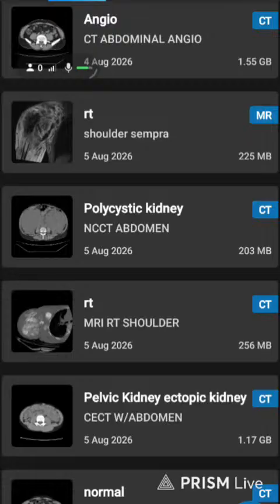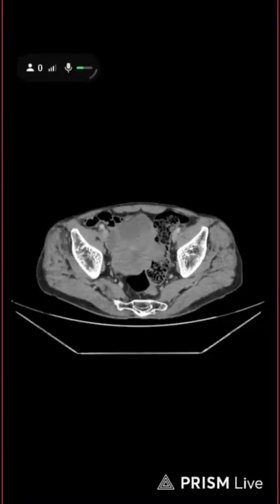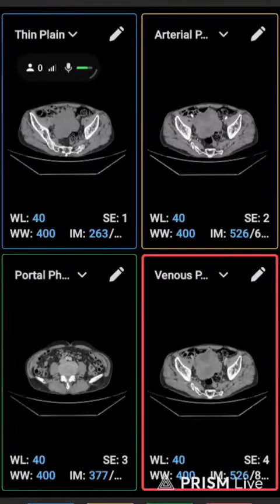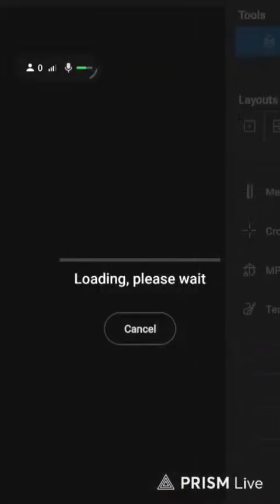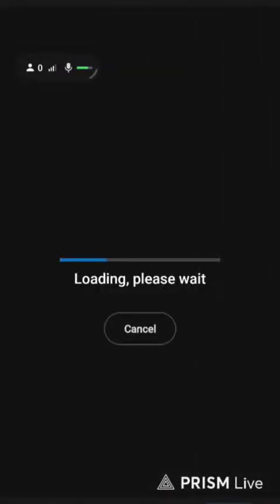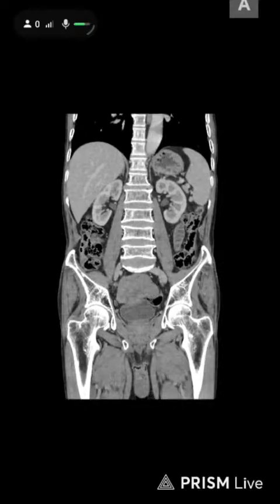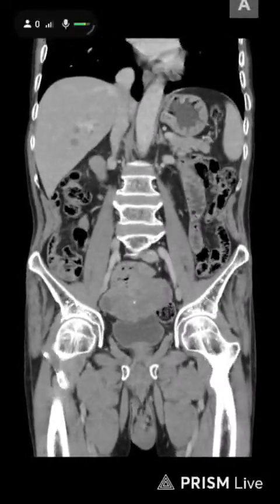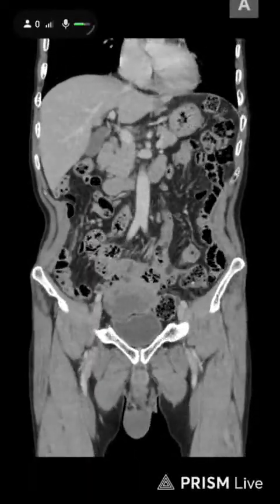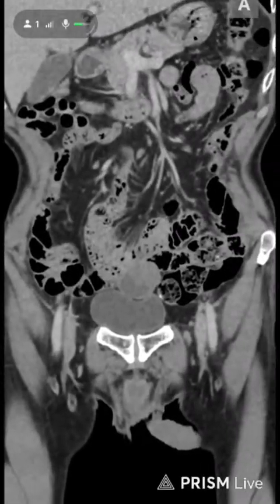Also we have an abdomen. Here you can see in this venous phase I found a different thing, but I haven't found the report or the diagnosis. I just see there was a lesion in this area. I don't know which organ connects with this lesion.